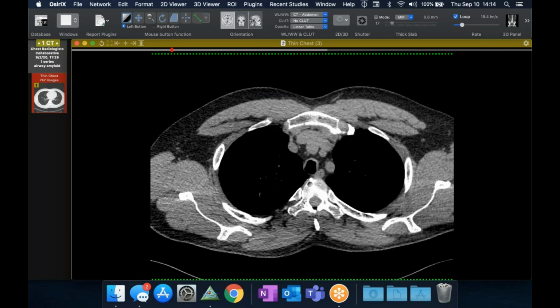Yeah. Because I have a couple cases where it's just those bronchial nodules. The trachea seems to be spared in those, and then you have the ones like this that really involve the trachea and mainstem bronchi, but tend not to go out farther. Right. Yeah. I don't know why that is. I think I've only seen amyloid about 4 times in the airways, and they've all looked the same. I'd say about half the time they're decently calcified, and the other half it's just smooth soft tissue. Yeah, it's like those parenchymal amyloid calcifications, really chunky, popcorny calcifications, but they're in the wall of the airways.